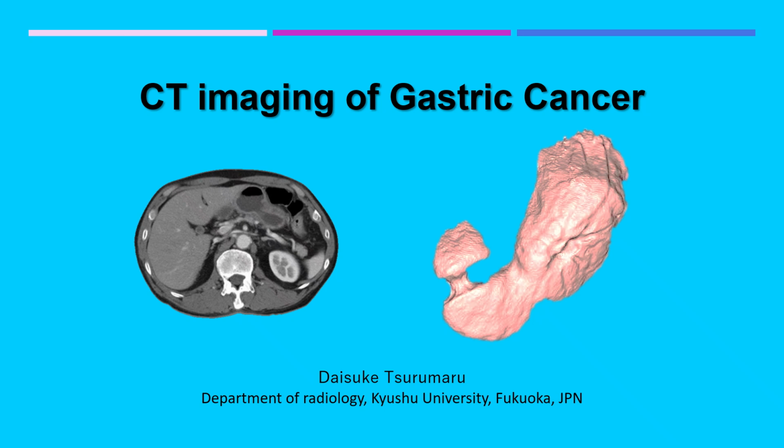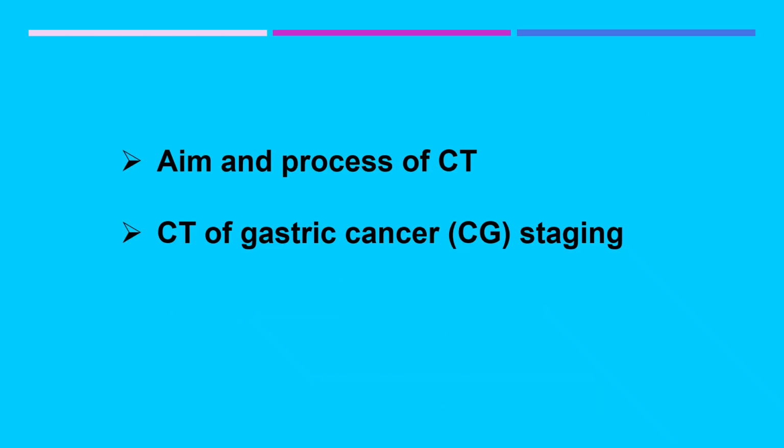Today, I'd like to talk about CT imaging of gastric cancer, its role, process, and advantages in clinical practice. Here, I will discuss the role of CT in gastric cancer and the diagnostic process. I will then move on to practical CT imaging.